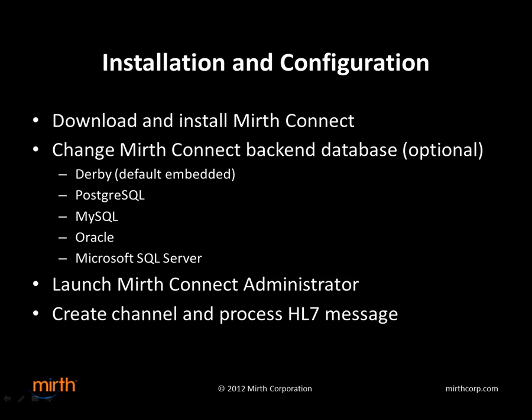Next, I'm going to launch the Mirth Connect administrator. And finally, I'm going to create a sample channel and process a sample HL7 message. And I'm going to do all of this in just a few minutes.